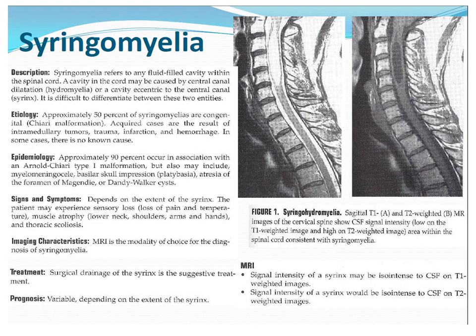And what you see here on the images is a T2 weighted image. You see some T2 hyperintense fluid signal intensity in the cord, and that's, of course, going to be low in signal intensity on the T1 weighted images. So it's really just a fluid-filled area, and it's usually right in the very center of the cord, kind of tapers off at either end.